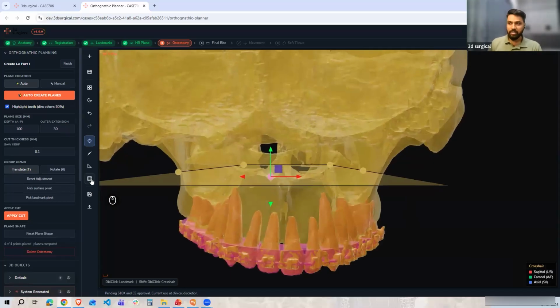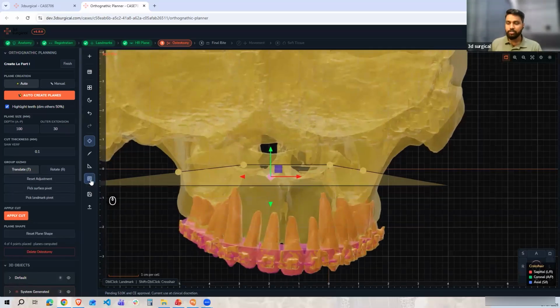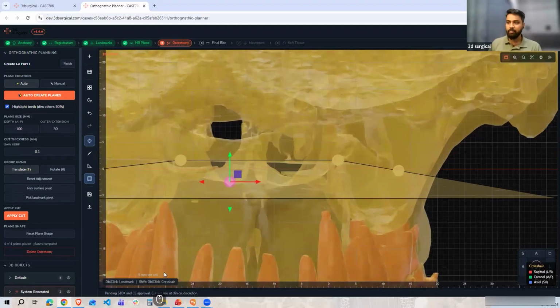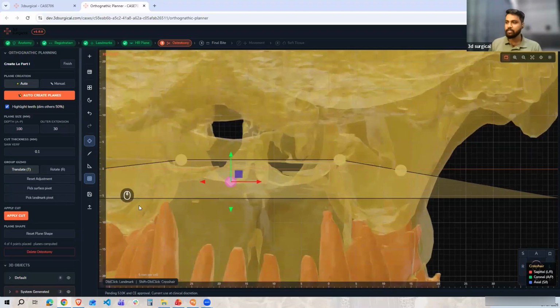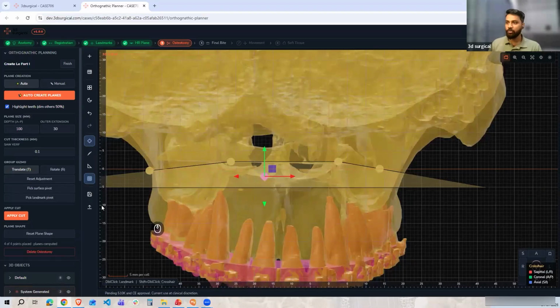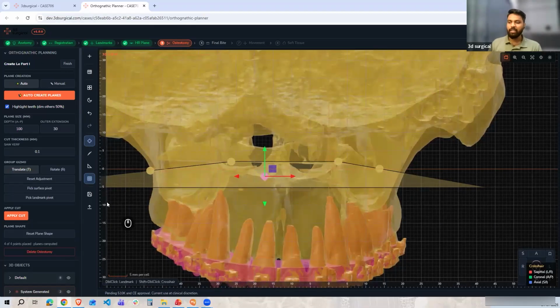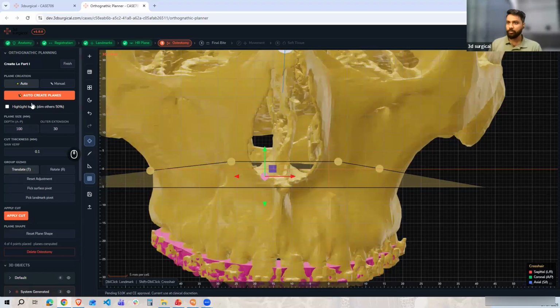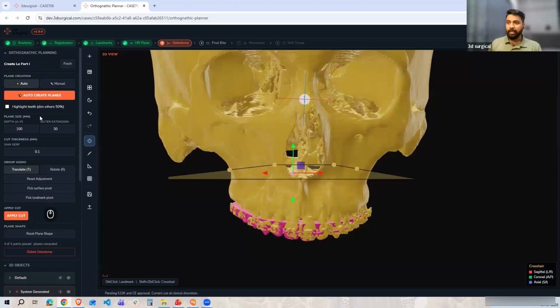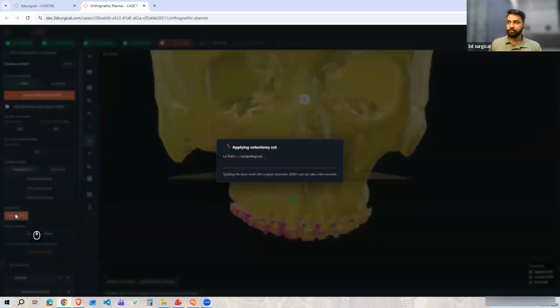And even let's say if you don't want to measure particular parts, we can just activate this grid, right? And now we can see each grid has 5 mm per cell, right? So if I locate here, it is 10 to about 0. So it has more than 5 mm, or we can say 8 mm of gap between the two, on both sides, which will be safe for me, right? So I can now hide my teeth over here, as well as hide my grids. Okay. And then we just need to place the cut.